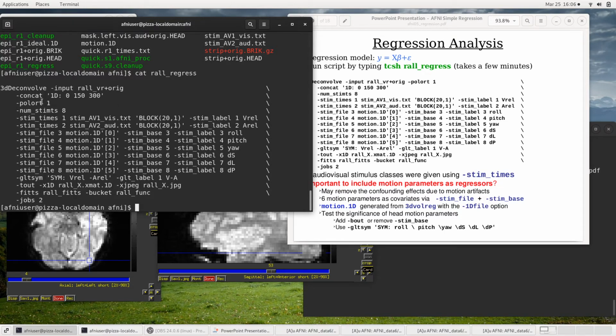Make them look pretty, line up similar options so that you can look at the command and quickly diagnose what it's trying to do. So we have a couple Unixy characters in here.